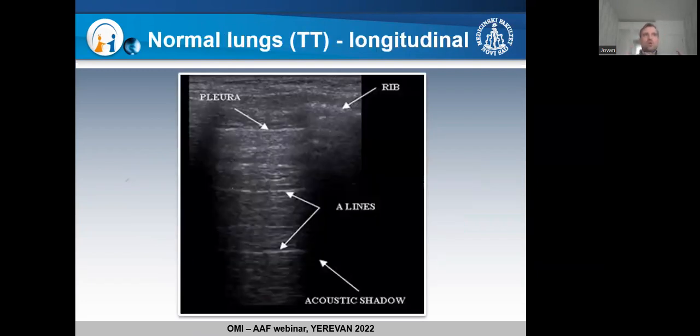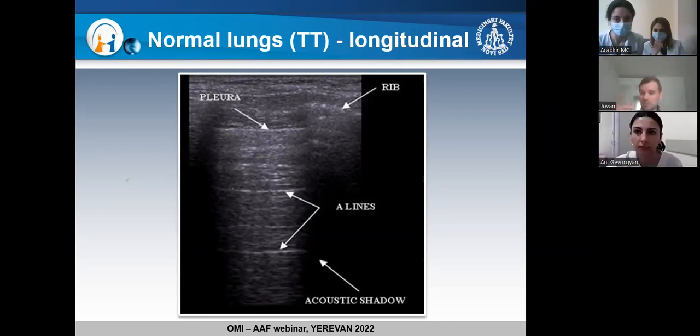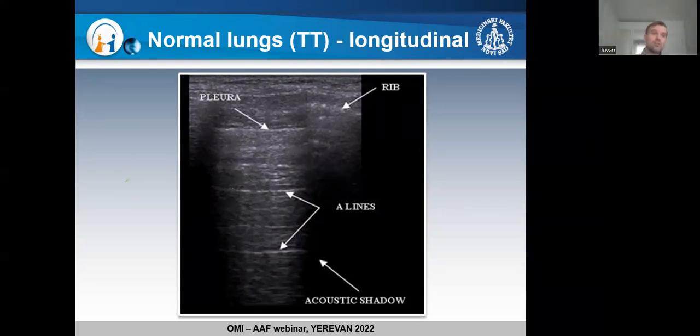So now you saw how a wide range of pathology we are able to see only by using transabdominal approach. And this is especially important for radiologists. Please pay attention to the lung bases. Even when you're doing a regular abdominal ultrasound, a lot of times when performing abdominal ultrasound, I saw the pathology within the right or left hemithorax. And this 13-centimeter hydatid cyst, for example, was seen during a regular abdominal ultrasound.